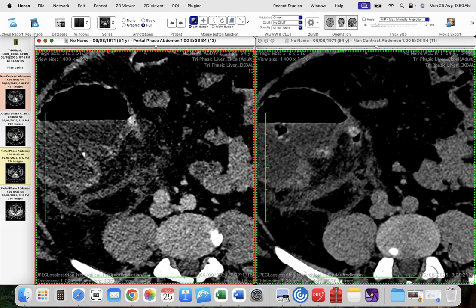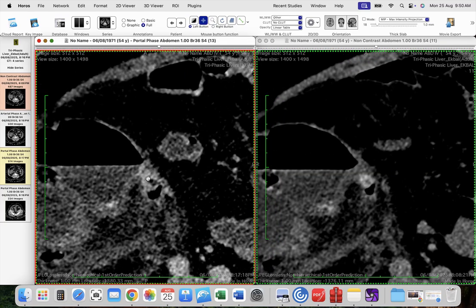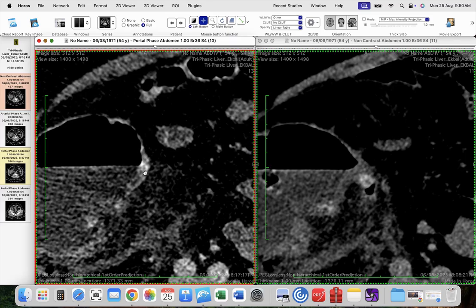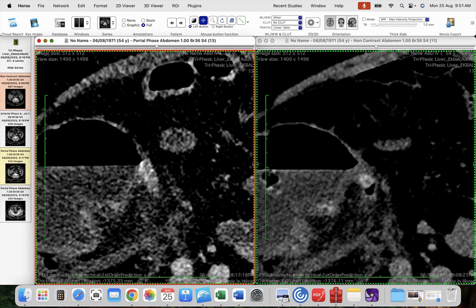We can see here there is an avidly enhancing mural nodule noted at the medial wall of the cecum near the base of the appendix. So you should mention this in your report, and it is very important, because if it is just a simple or complicated appendicitis sequel to a fecalith at the base, a specialist surgeon can do the operation.